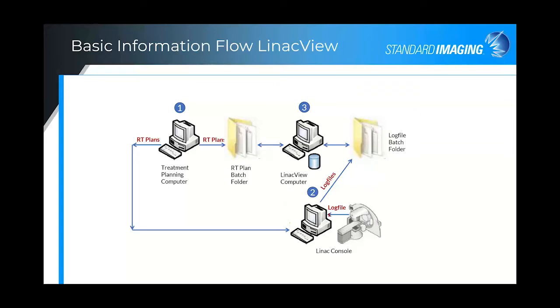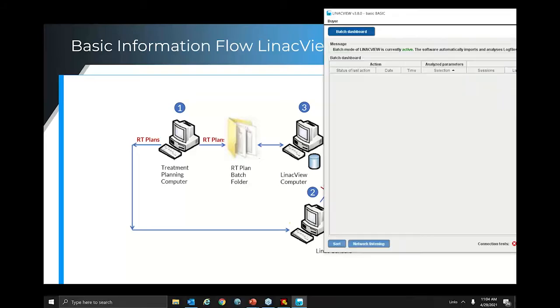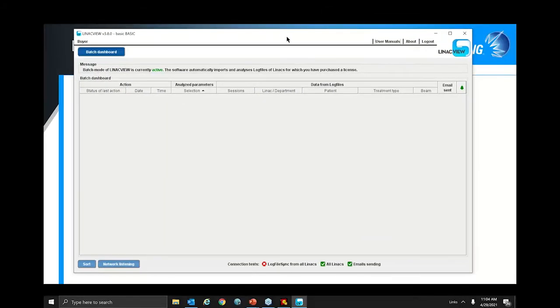So let me pull that software over. And right now I have a blank dashboard because we haven't started treating patients yet today, but the RTPlans are already picked up by LinacView. So I'll just go ahead, and the Linac is up and running.